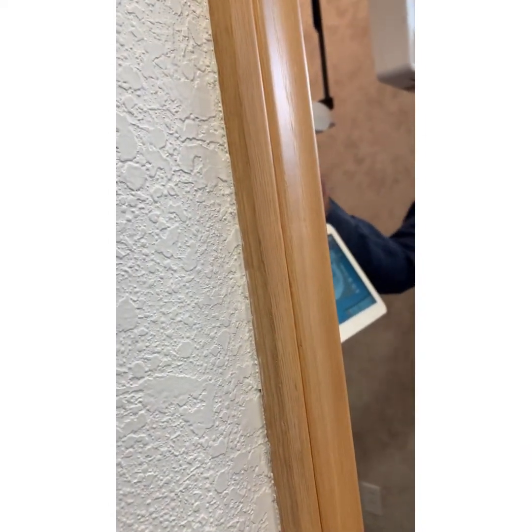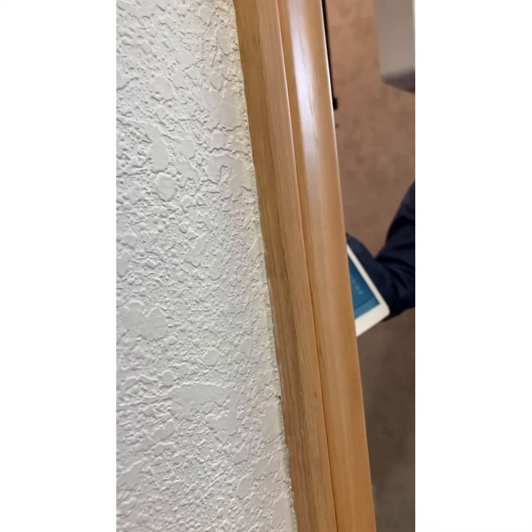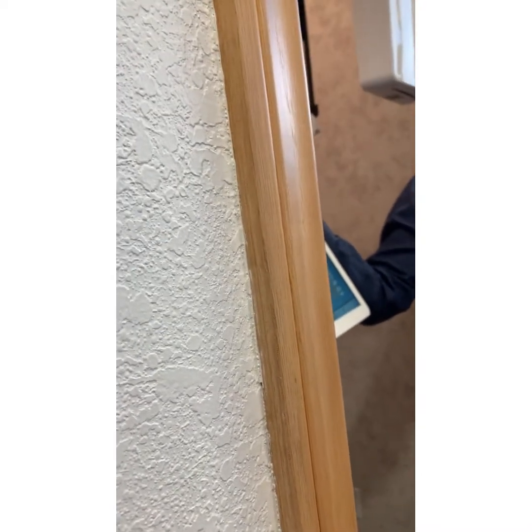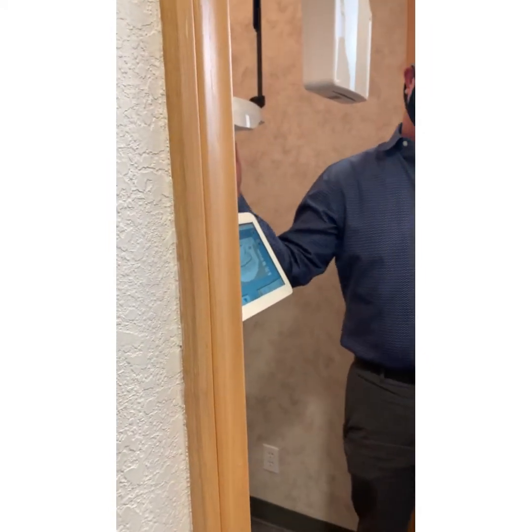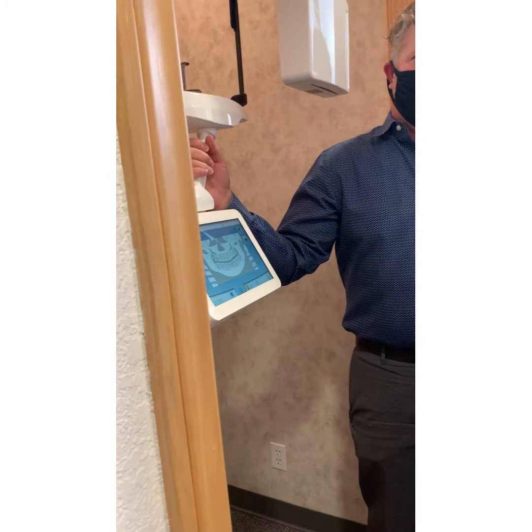You know what? On the phone, when we know they're going to get a CT, we should mention that to them. Just tell them to leave all your piercings at home. Or you can just say, as much as you can, different piercings reflect off the scan, and it makes it a little bit harder. If there are some you can take out, that'd be great. We usually have them put them in a cup when they get here, before we take the pan. People don't want to take piercings out and leave them home because they're afraid the hole will close.